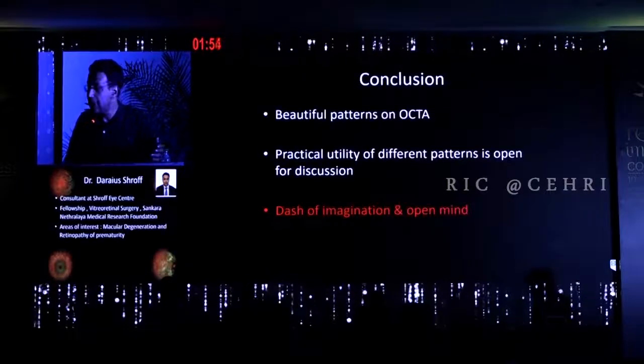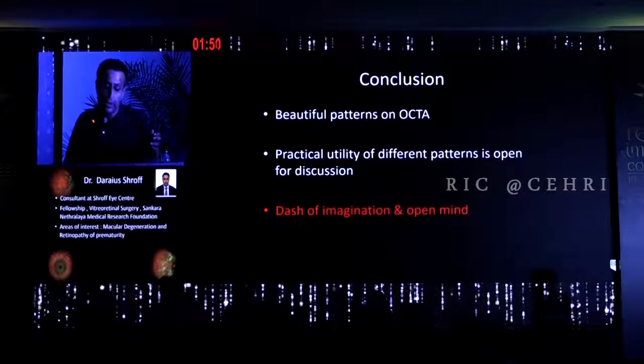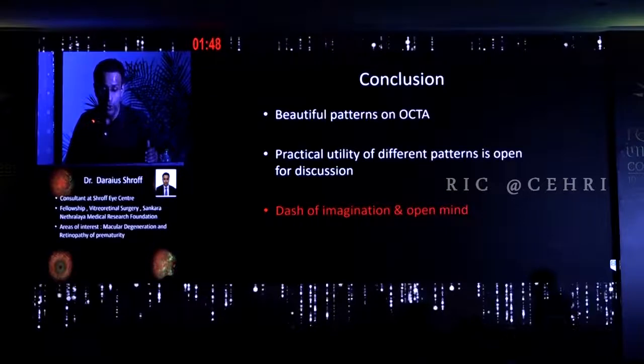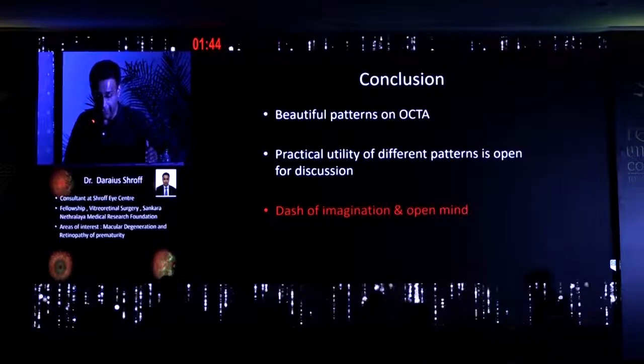So to conclude, we see beautiful patterns on OCTA of wet AMD. Practical utility, I'm not very sure. It's open to discussion. A dash of imagination and an open mind go a long way in seeing these lesions.